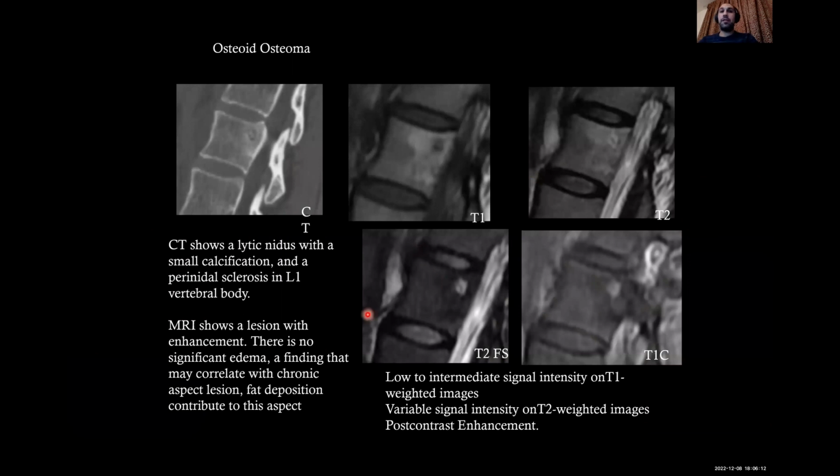here it is. This is the lesion. What do you think about this lesion? This is osteoid osteoma, don't be dumbfounded, it has a lytic lesion with matrix and surrounding sclerosis in the spine. This is more common to happen in the posterior element, but it is now in the anterior element, with these features and the patient's history, the pain, and the enhancement. There is enhancement. Okay.